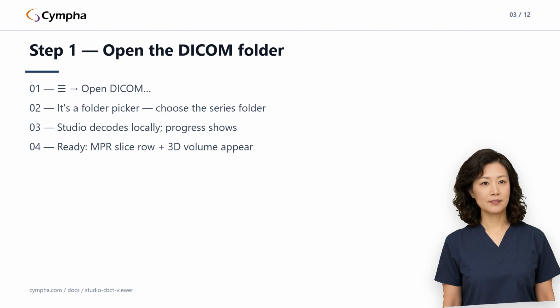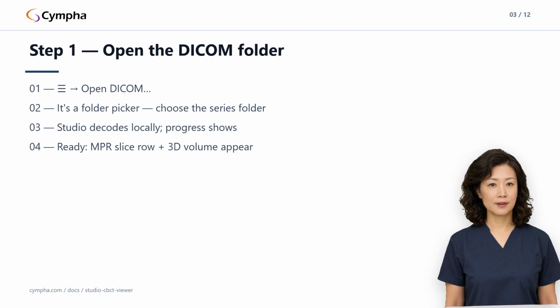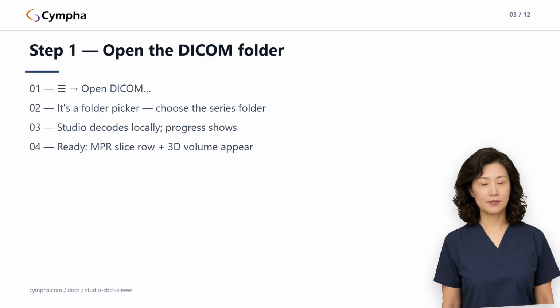Once the CBCT is in, a small floating dock appears on the left side of the viewport with 2 icons. The rendering icon opens the View Tools panel. That's your home base for this whole lecture. The CT volume controls, the arch curve tool, the slice mode buttons, and the HU threshold all live there. The implant icon opens the Implant Tools panel, which is for implant planning and gets its own lecture. Ignore it today. Click the rendering icon now.